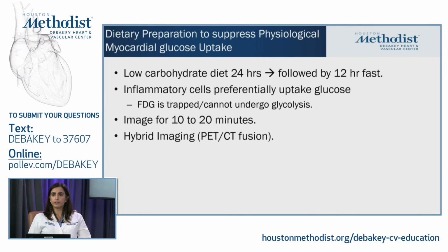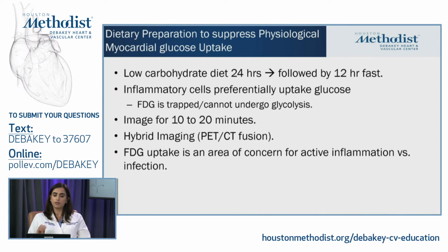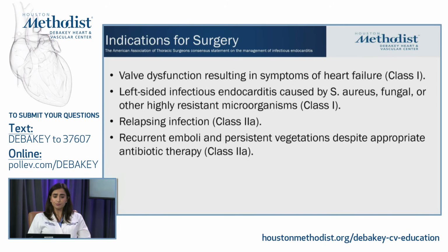We use hybrid imaging with CT, a fusion technique where the anatomical images are defined with CT, and we superimpose the PET images to delineate which areas are involved. And any area of FDG uptake is a concern for active inflammation versus infection.